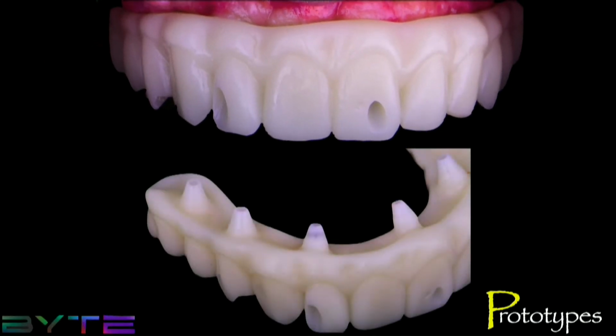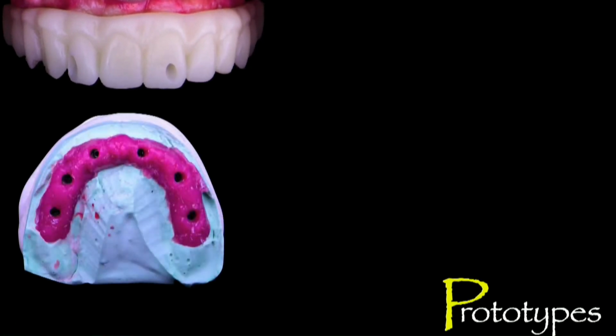Now, as you can see in this case, this prototype was actually printed to the implant level, meaning that we don't have abutments attached to that prototype, which I think is very valuable and impressive. You can actually see stress patterns here after you deliver this model. If you look at this here, we can definitely address this in our final restoration. But for now, I'd like to focus on the screw access hole position. We have many ways to correct this.